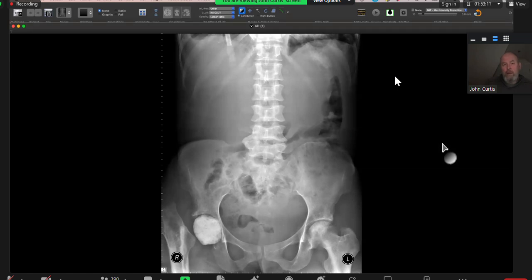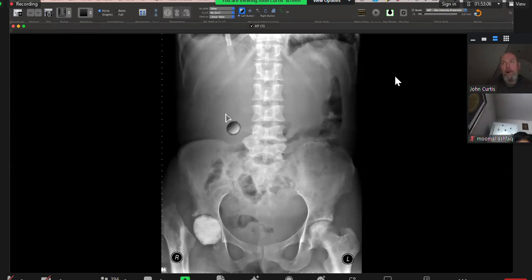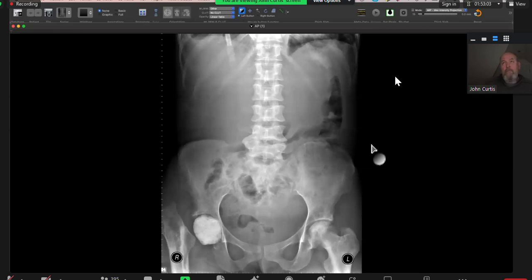There seems to be paravertebral soft tissue opacification bilaterally. That's okay actually. So you've got H-shaped vertebrae. You've got a calcified lesion at the left upper zone, left upper quadrant. I'll come back to the hip in the feedback, but essentially it's an operation to remove, a total hip replacement, and this is a young patient with abdo pain. Right. So this is most likely a case of sickle cell disease. It is sickle cell disease, yeah.